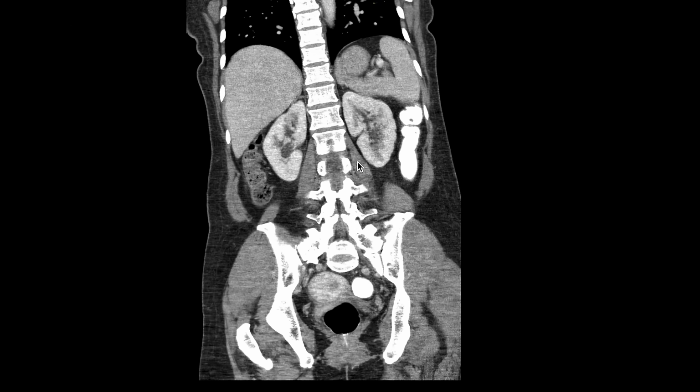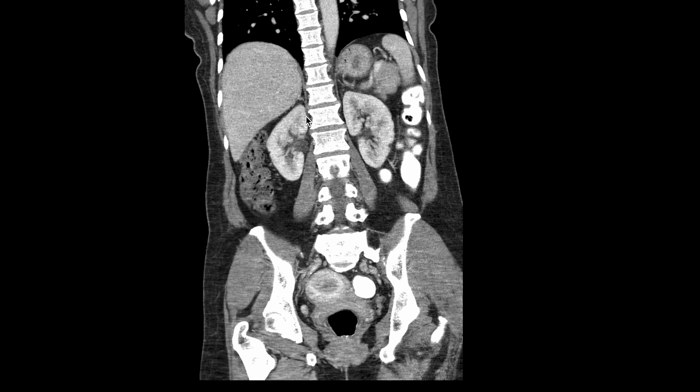How a normal kidney looks is going to depend on the phase of contrast. So when you initially give contrast and look at kidneys closer to an arterial phase image, a lot of the contrast is still in the kidneys peripherally. The contrast is going to fill the renal cortex first, and then it's going to move towards the center or towards the hilum. So early on in the arterial phase, you're going to see only more peripheral enhancement, and then over time you're going to have more homogeneous enhancement of the entire cortex, and then it's going to enter the collecting system, and you can do delayed imaging if you want contrast in the collecting system to better assess the collecting system.